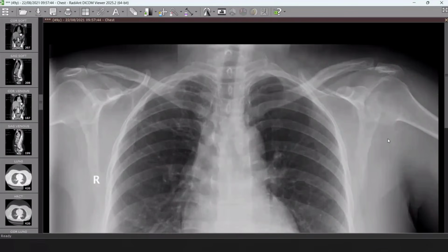Do you have any associated abnormality? I have a suspicion that there is some cystic lucency. Yeah, you are right. Perfect. Very nice. You have cystic changes also. Besides the reticulations, how can we determine the cystic changes? Do you call it comma reticulations or something else? Here we have cystic changes.